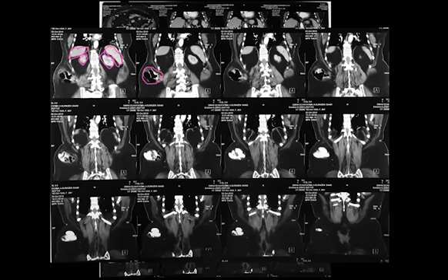يلا يا منى ايه اللي بيحصل للست دي؟ ده شكله باول. باول موجوده ليه؟ What did you say, it's a bowel? This part that you marked has air and contrast. Part of it was not full of contrast yet but then the most distant part is full of contrast. And where is it present? In the femoral area. You think so? It's the femoral area?